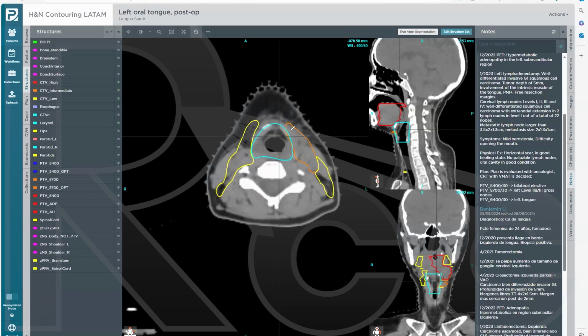So we talked about the posterior third. I know this does not have contrast, but this is the posterior third of the thyrohyoid muscle and the anterior edge of the sternocleidomastoid muscle, right? So we're going to have like a thumbs up sign, medial edge of the carotid here, and we're going to go to the posterior edge of the sternocleidomastoid muscle.